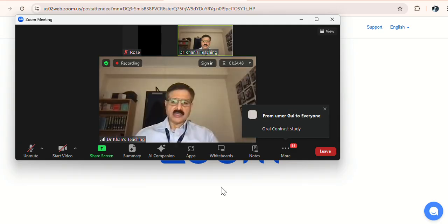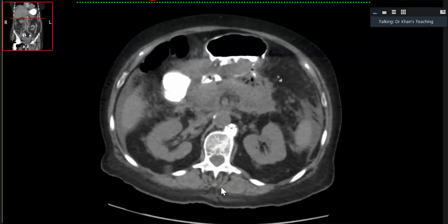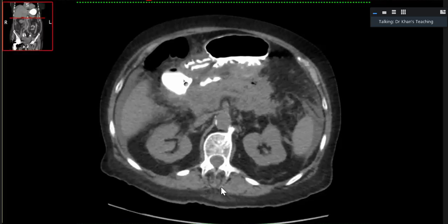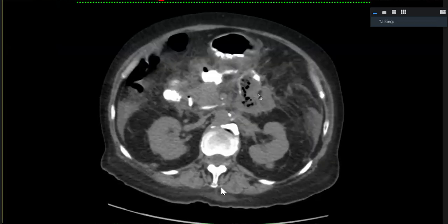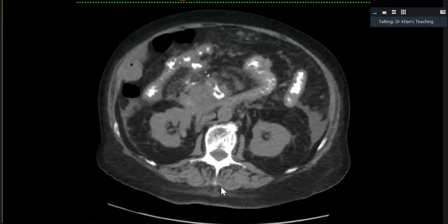So in this particular case, we gave oral contrast and then did a non-enhanced CT once again. This is oral gastrografin. Now if you come here, this is the D1. From the D1, you can see that there is leakage of contrast into this abscess, the lesser sac. And from there, you can see a ramification.